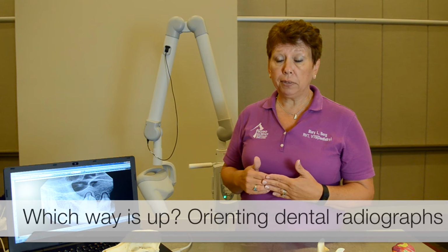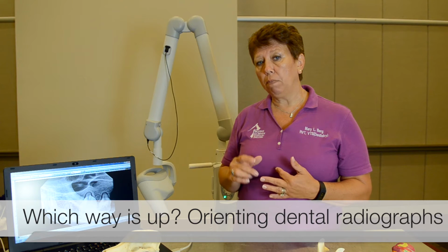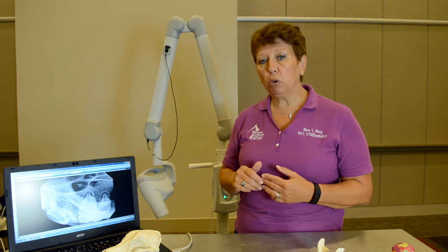If that doesn't happen, you need to be able to figure out what x-ray you're taking or what tooth you're x-raying. One thing I do recommend is you can always rotate your x-rays if they're in the wrong position, but don't ever flip. If you flip the x-ray, it becomes very difficult to know what side was the original. So always just rotate it.